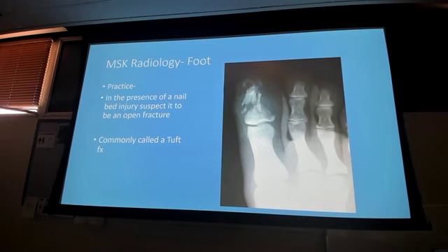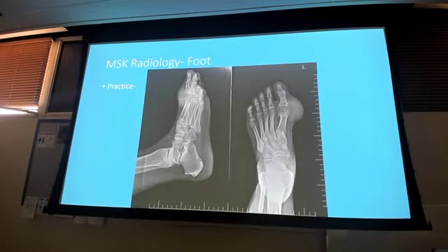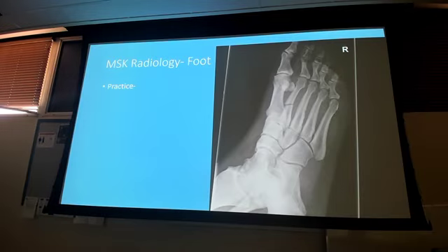Look him up. Always look him up. What's this? Gout. That's prose. Beautiful. What do we got here? Second and third metatarsal transverse fracture. Boom and boom. Here and here. Good.